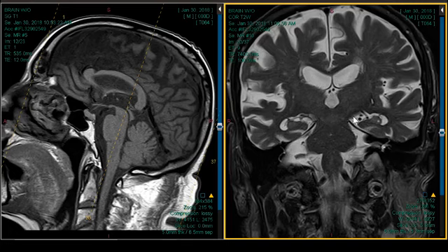You could see the temporal horns being very large, out of proportion. You could see a huge amount of atrophy. You could see if the patient's had a ton of strokes, that could be a Binswanger's type disease. So there's probably a lot you could do. On the other hand, if you're talking about multi-system atrophy, Parkinson's, those sorts of things, you probably have to recommend MR for that, and you might just say that. You say, okay, the patient doesn't have NPH, doesn't have a subdural, doesn't have this, has substantial vascular disease.